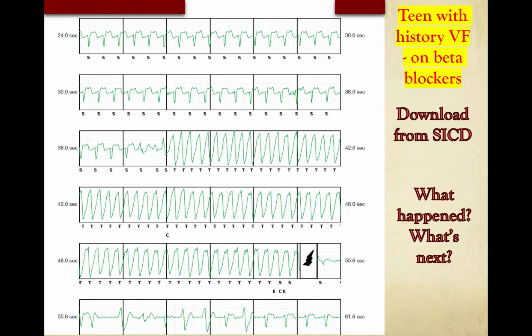So what are we looking for when we do this? Well, the first thing we want to see is, did it get the patient out of the arrhythmia? And the answer, of course, is yes. Did it get out in one shock? Yes. So here's the shock here, and the patient is definitely in sinus with, as you said earlier, some PVCs, a couplet, but definitely got out of the arrhythmia.